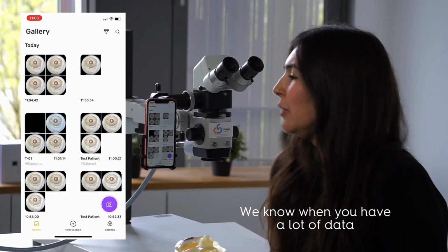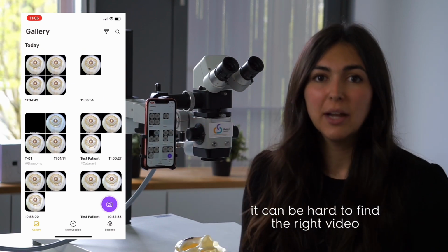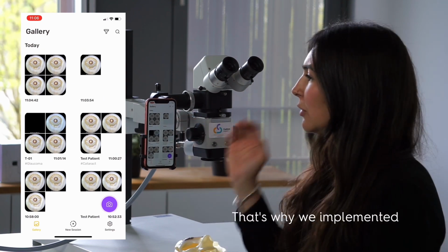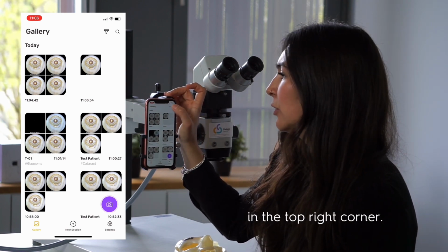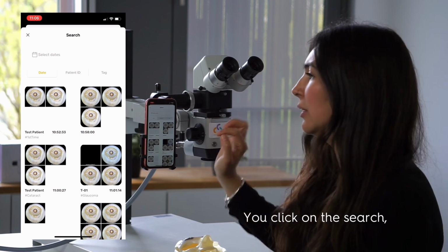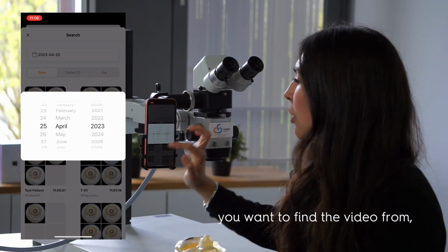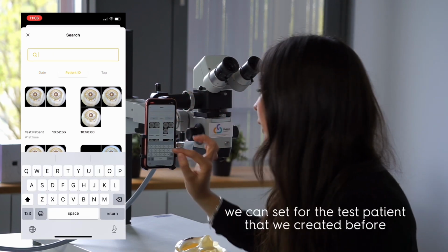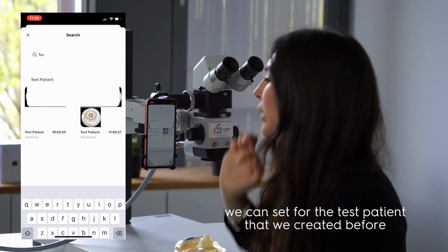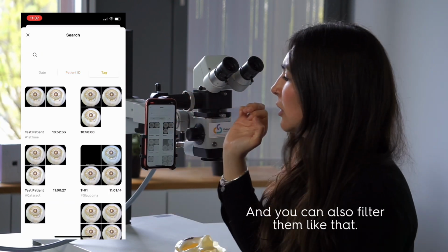So we know when you have a lot of data and a lot of sessions, it can be hard to find the right video that you want to show to your colleagues. So that's why we implemented the search and filter buttons. They are here on the gallery in the top right corner. And if you click on the search, you can select which day you want to find the video from. You can also search by patient ID. So for example, we can check for the test patient that we created before, and you can see that we have two sessions there.